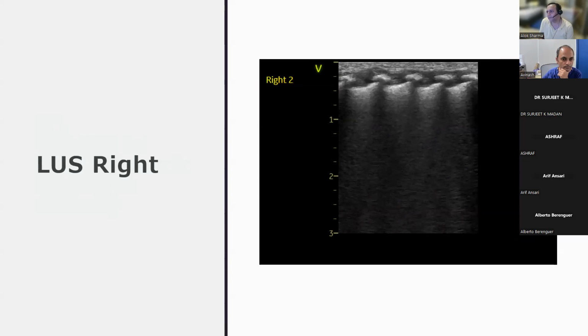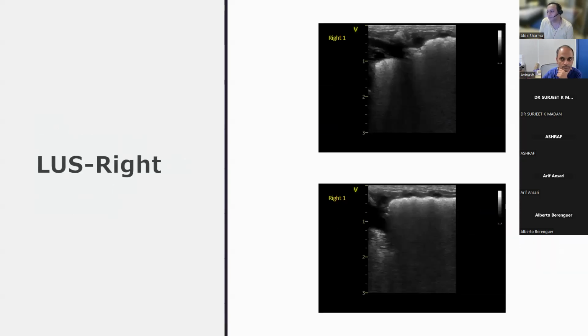Yeah, there is no R1, the last slide. This one. There is no, here some pleural fluid here. Over here? Yeah, no, this one. No, there is no, in R1 here. Yeah, basically.